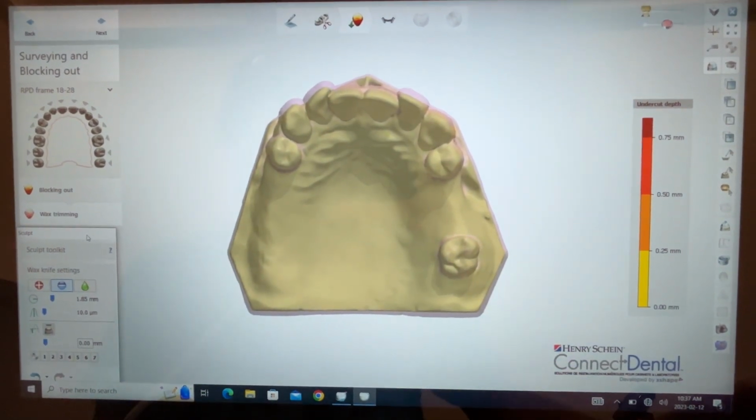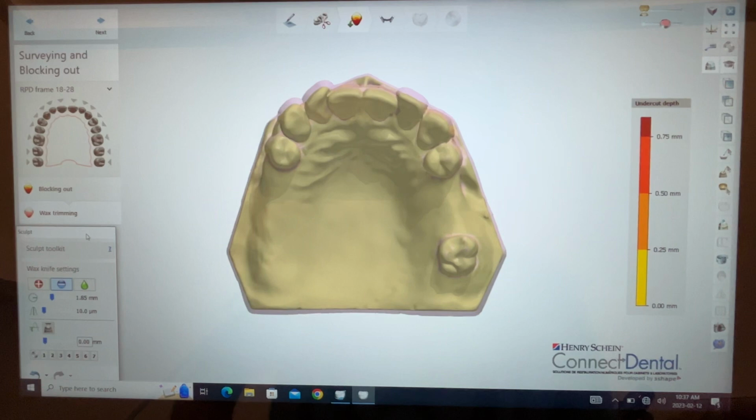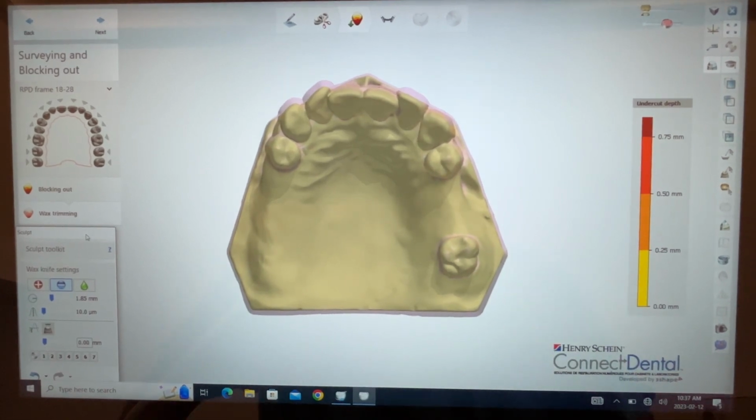Okay, part two for the beginners. Like me, I think that's who this video is good for, the beginners, so you can see how frustrating it can be for me as a dental technician embarking on a new technology. And new technology for me, it's not that new, it's been out for some time. But we're always reluctant to get out of our lab coat and out of our comfort zone around the plaster bench and the lab bench and sit down and say, okay, how's this going to work out for me now?